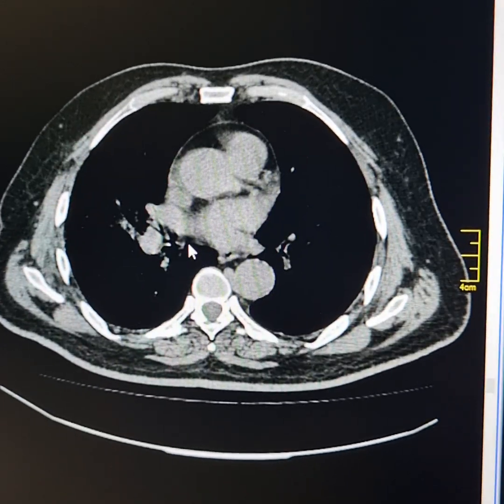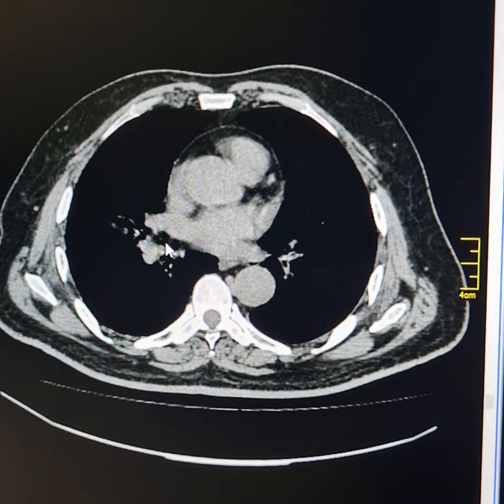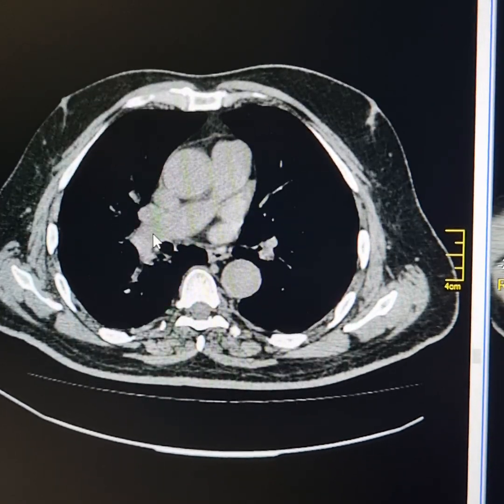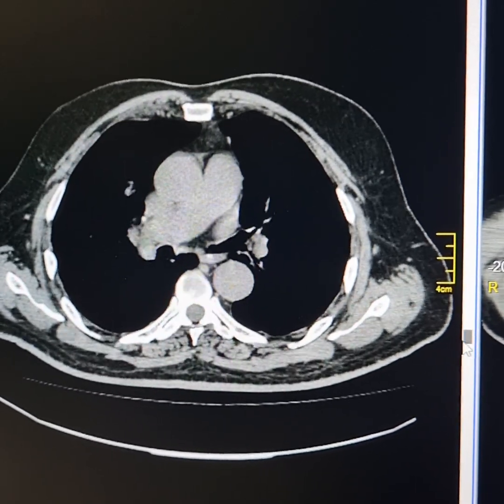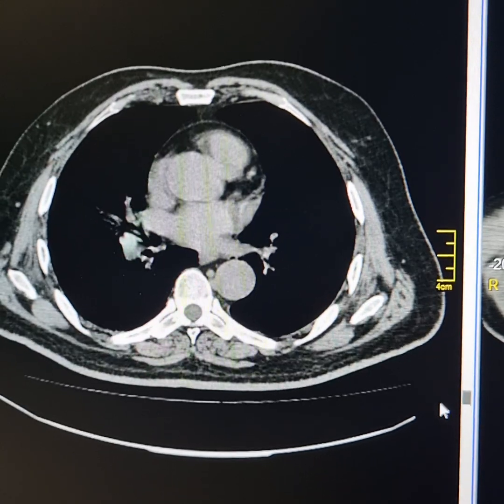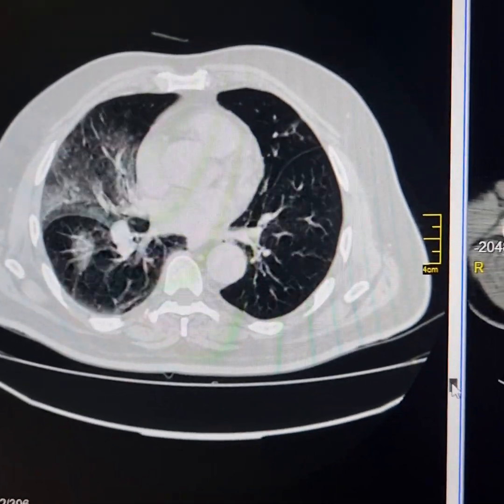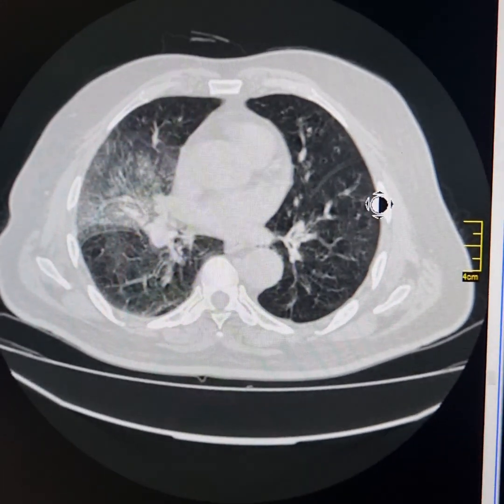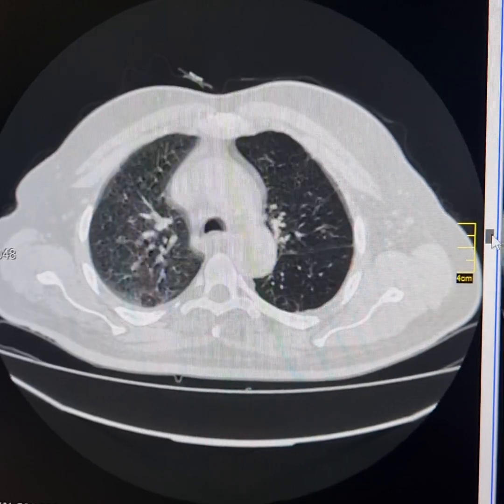There appear to be small lymph nodes in the right infrahilar region, which probably are obstructing the right upper lobe and middle lobe segmental bronchi, resulting in pneumonic consolidations. But these would have been much more clearly appreciated if a contrast enhanced CT scan was available.